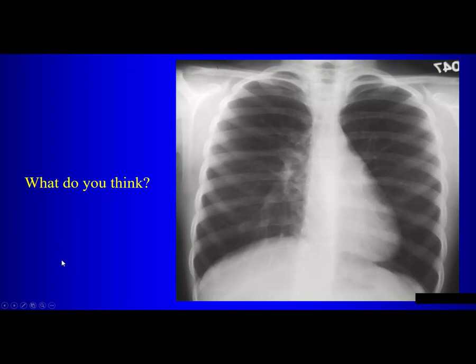Okay? Now in this case, which lung is abnormal? Well, is there anything abnormal here? The right lung, I think. Well, what do you think of the mediastinum here? It's shifted towards the left. It's shifted towards the left, yeah. So which lung is the abnormal lung? The right lung or the left lung? Okay, let's say the left. There's volume loss maybe on the left then.